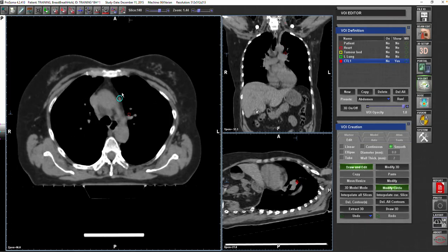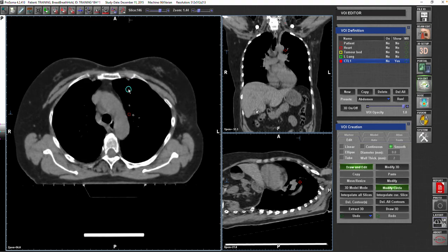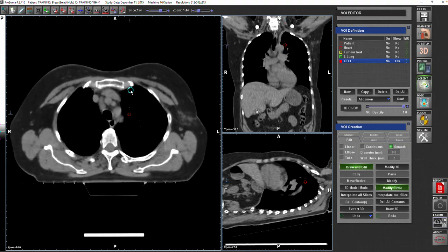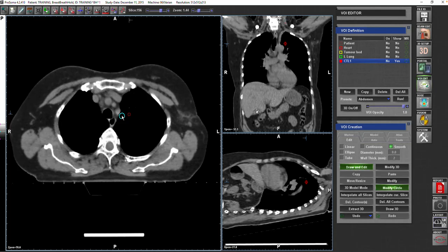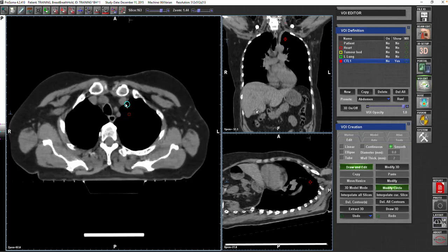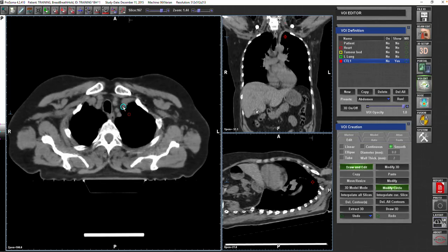So when you go down and see two dots, don't be surprised that these dots will disappear and end up as one dot like that. Still, when you draw the internal mammary, as we will come to see, you take 5 mm around it, but don't expect to see two dots. You will see only one dot because the internal mammary vein left the artery to join the innominate.